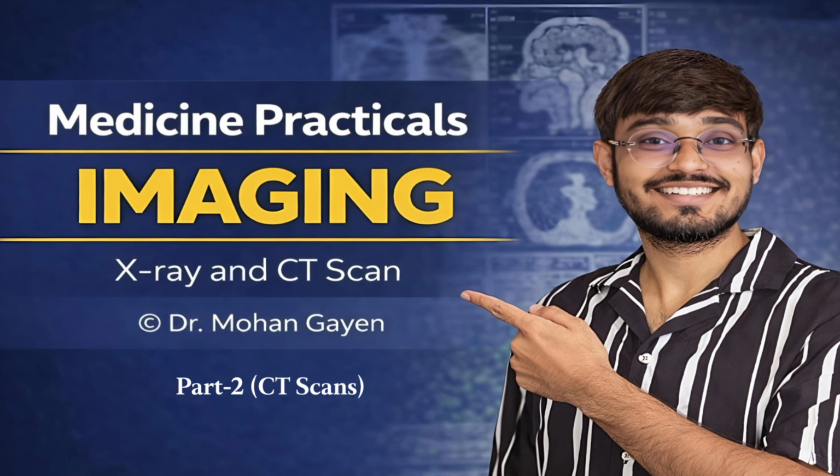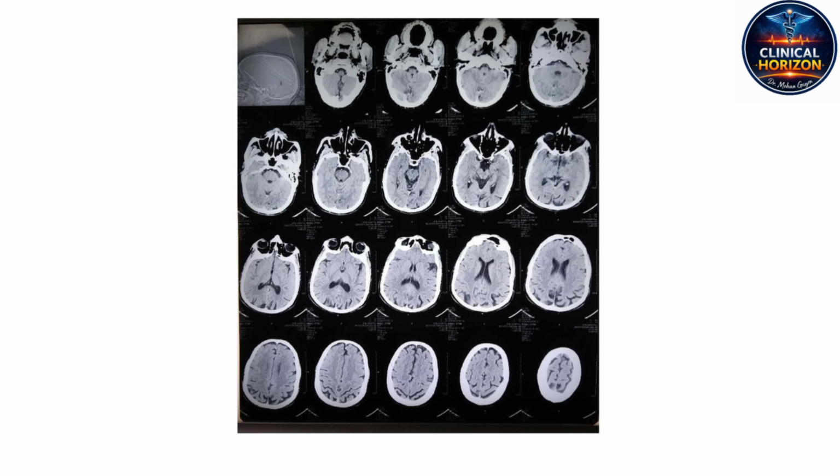You evaluate the calvarium for fractures, systematically trace the parenchyma to confirm gray-white matter differentiation, assess the ventricular system for effacement. Checking midline structures for any shift. Yes, and meticulously clear the basal cisterns, the extra-axial spaces, and the posterior fossa. That rigorous, reproducible framework is really the only way to reliably catch a subtle, life-threatening crisis.